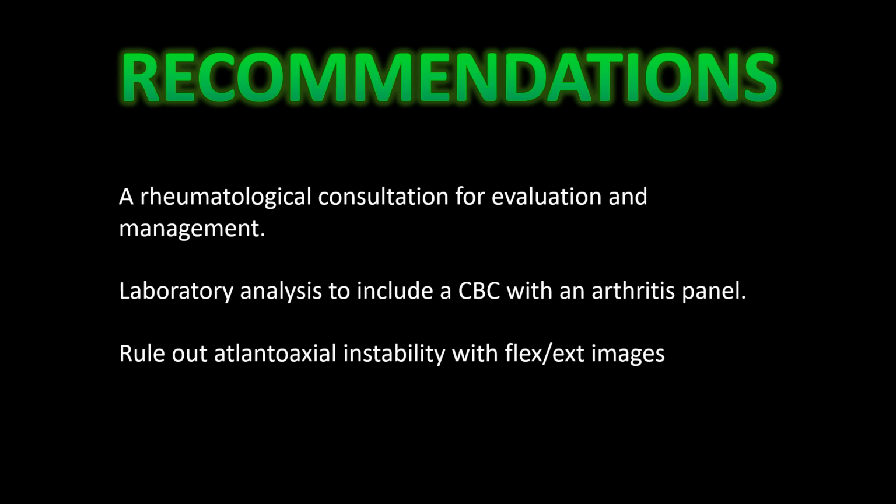So with any type of manipulation of the upper cervical spine, flexion extension views should be done to exclude any instability of that upper cervical region.